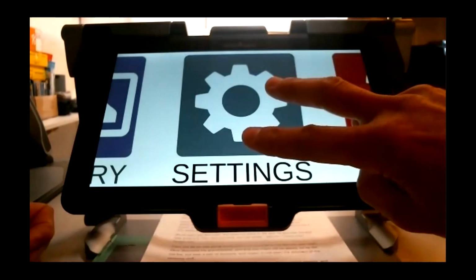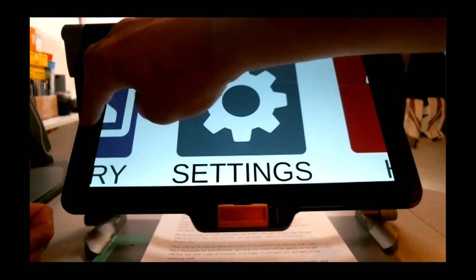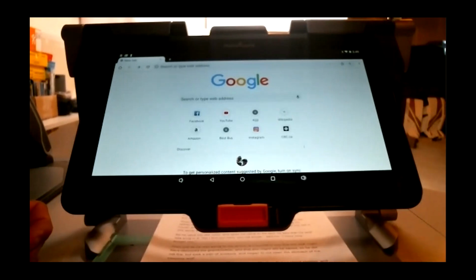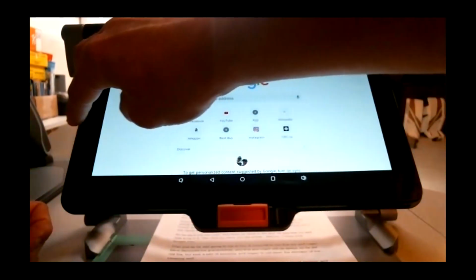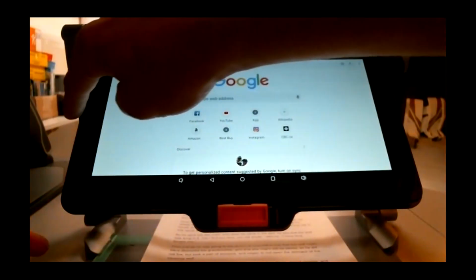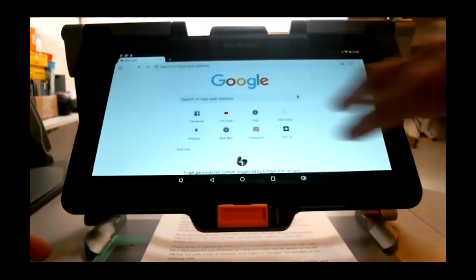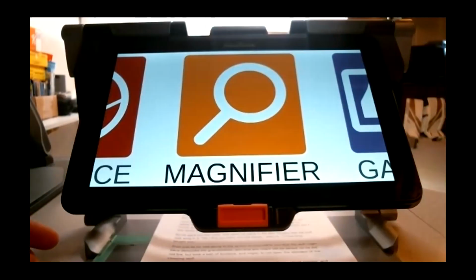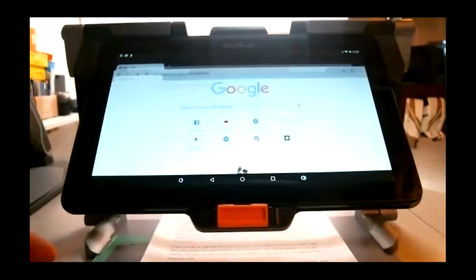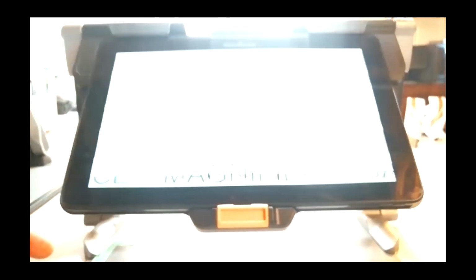So what you want to do is take two fingers, and I'm going to start at the edge of my screen. I have to be at the edge and just swipe to the right. I'm going to show you again from the outside of the screen. I really have to start on that black part of the screen. Really outside, two fingers about this far apart, and then you just swipe to the right, and that will swap back to Prodigy. I think that's going to be a very liked feature to swap from one application to the other. And again, I can have as many applications as I want.